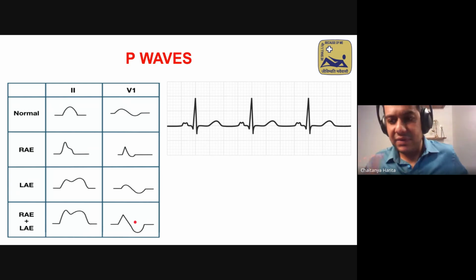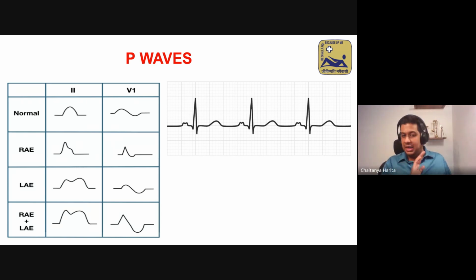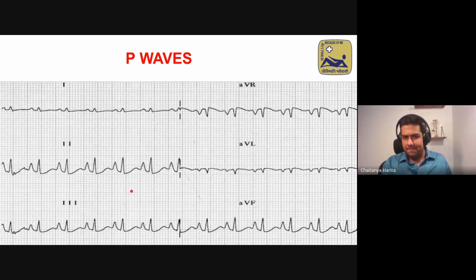So eyeballing the P wave is something nobody does because it's a small wave. You say, okay, is it there? Then it's sinus, let's forget about it. Never forget the P wave. It is the start of every cardiac cycle.